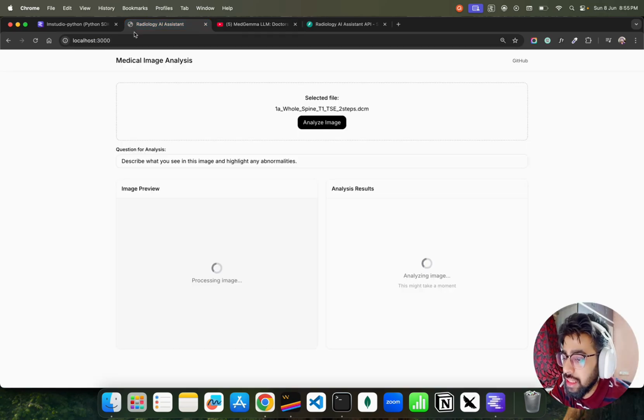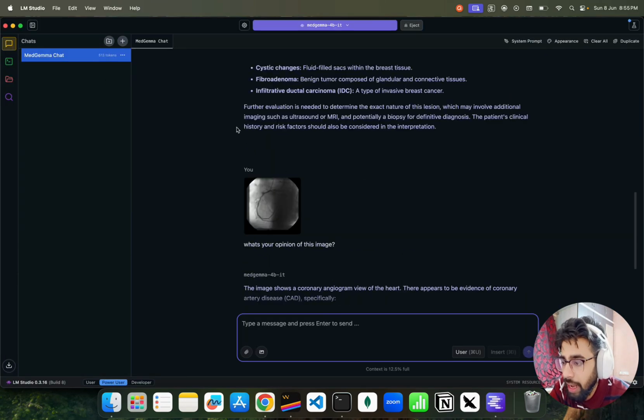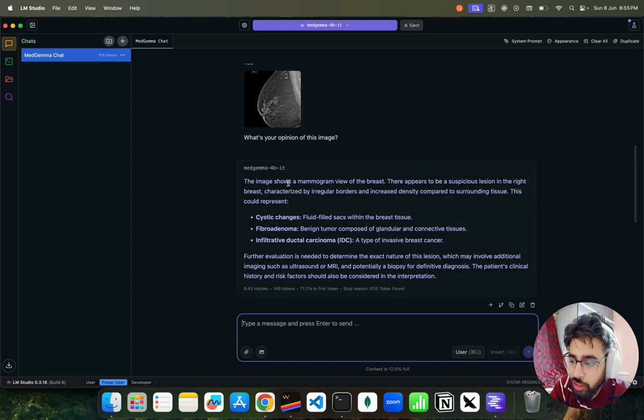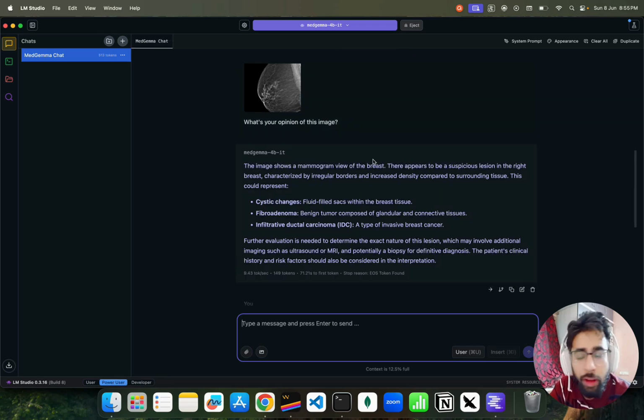Now, in this video, we're going to extend that because there we used a tool called LM Studio. Right, we used this tool, LM Studio, and I've shown you how to download a model on LM Studio and how to ask some questions about a medical image, finding out some anomalies or finding out what's really happening within that given image.